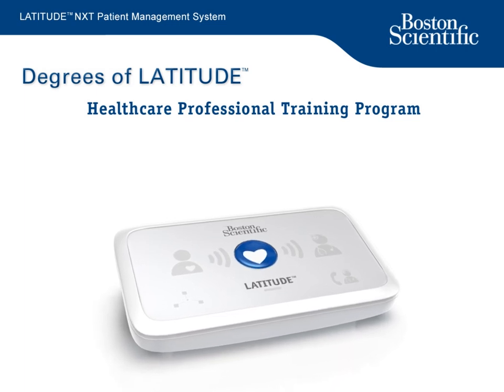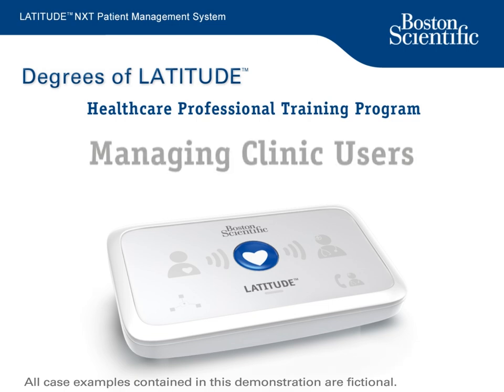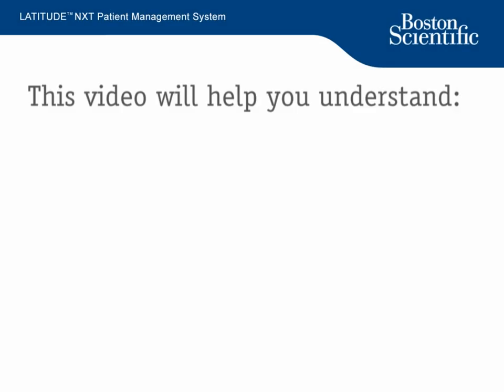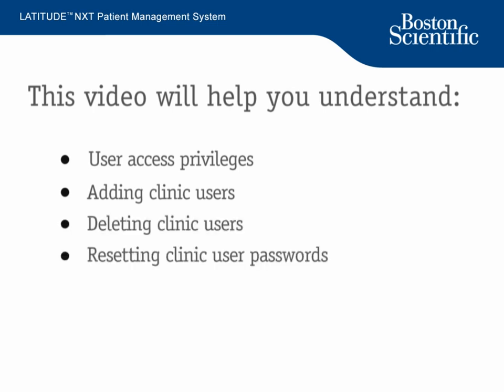The Latitude NXT website offers you flexibility and control over how you receive, review, and manage Boston Scientific device and patient data. In this training module, you will learn how to manage clinic users in Latitude NXT. After viewing this video, you will better understand user access privileges, adding clinic users, deleting clinic users, and resetting clinic user passwords. Let's start by exploring user access privileges.